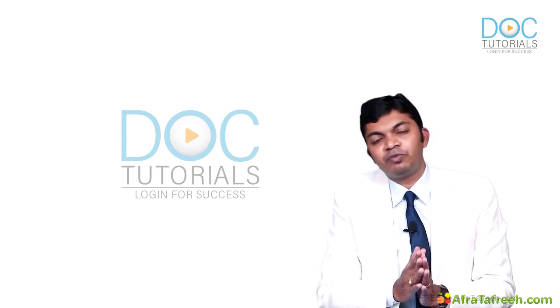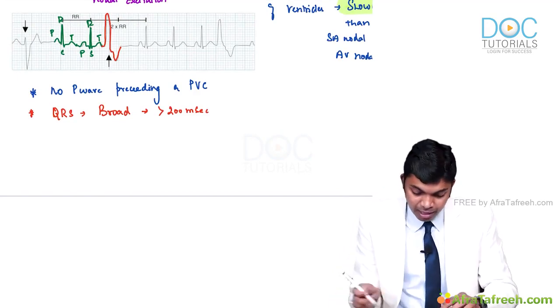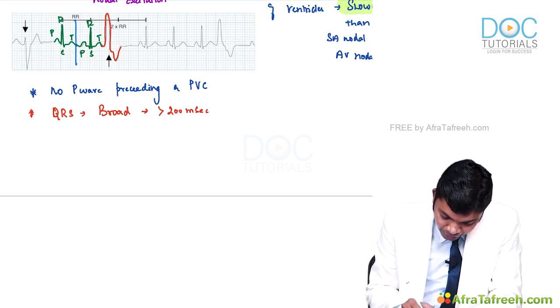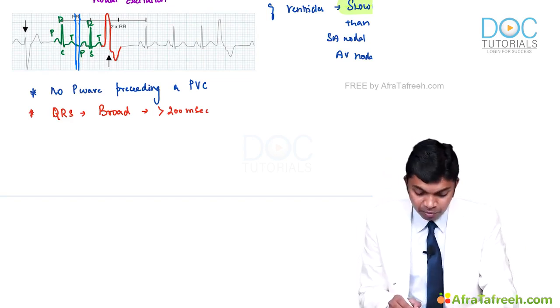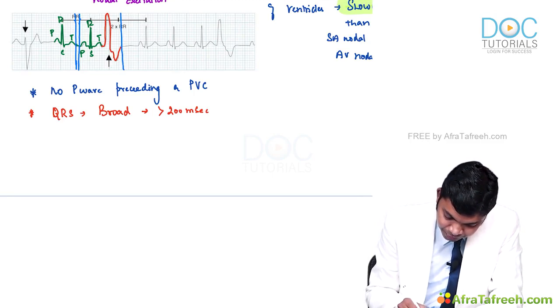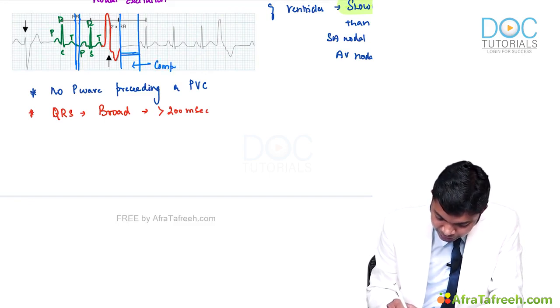So, after every single premature ventricular complex is over, the ventricle takes an extra duration of pause, and that we call a compensatory pause. Okay, look here, in normal QRS complexes, two consecutive excitations, one PQRST and the second PQRST, occur at a very small spacing, whereas if there is one premature ventricular complex, it takes up a lengthier compensatory pause, doctors. This zone is called the compensatory pause. So, we have one such compensatory pause here, right.